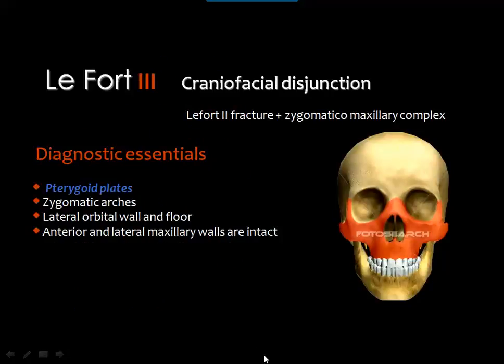Then the most severe one of these fractures is the Lefort type 3, which is known as craniofacial disjunction, because there is almost complete separation of the face from the cranium. And to appreciate this fracture, you add the type 2 Lefort fracture plus zygomatico-maxillary complex.